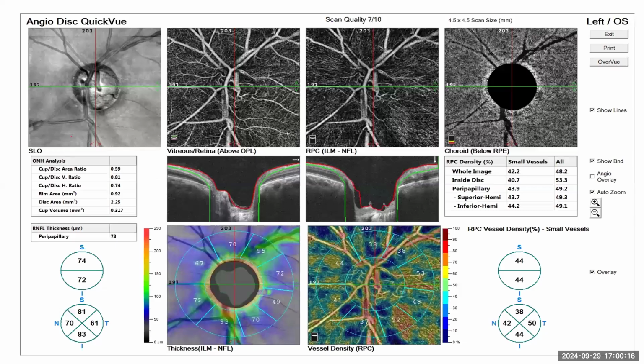So I'll go over this scan again and allow us to think along with me as we look through it. So now here the superior is 38 and the figure in my mind is 52, 51. Although the older the person is, the more likely a lower figure would serve.